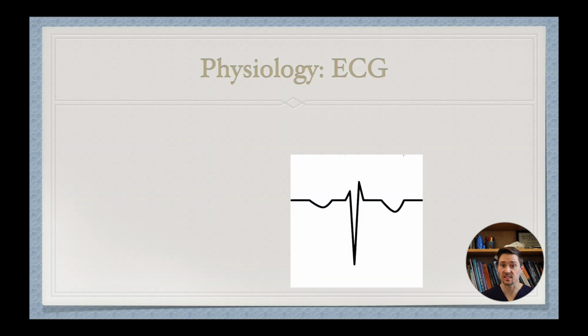So let's say that your patient comes in and for whatever reason, they need to be hooked up to the ECG. You hook them up and their ECG complex looks like this. Geez, what went wrong? What's going on with him? What is this arrhythmia? Well, I told you, we're not going to look at arrhythmias today. This is a trick question. It's actually, you put the leads on upside down.